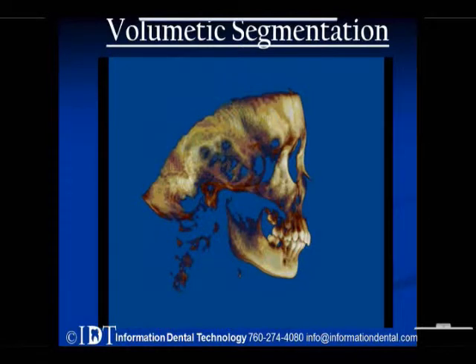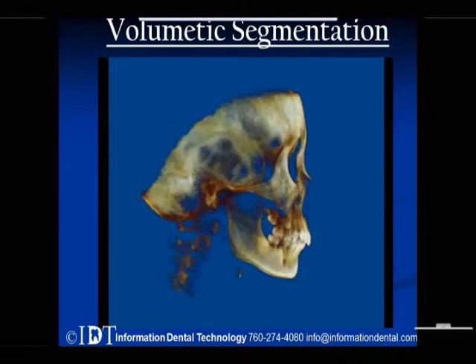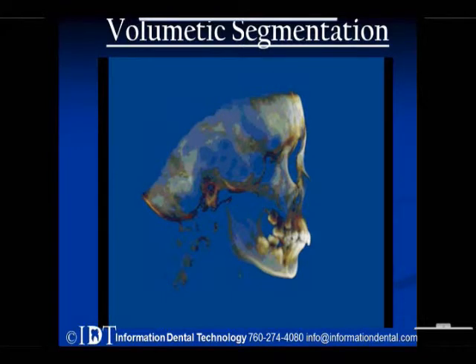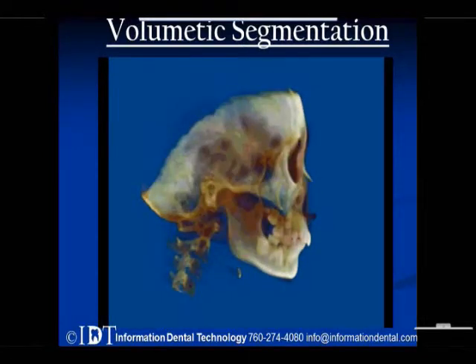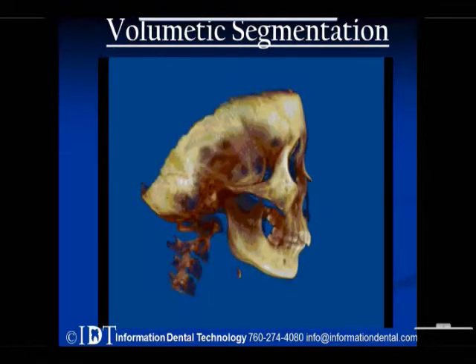And when we create the 3D model, it's set on a threshold using Hounsfield units. The Hounsfield units represent the level of density. So the higher the number, the higher the density. The lower the number, the lower the density. So if we pick a number that's high on that threshold, then it's going to discard any densities that are lower than that particular number.